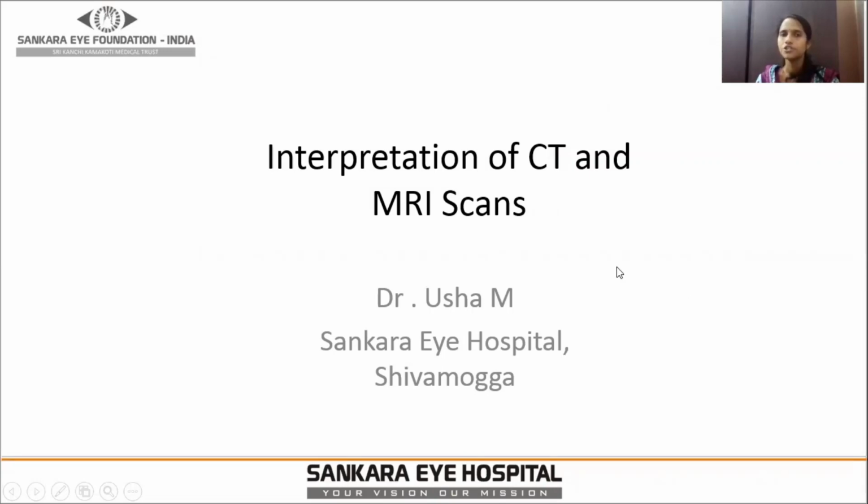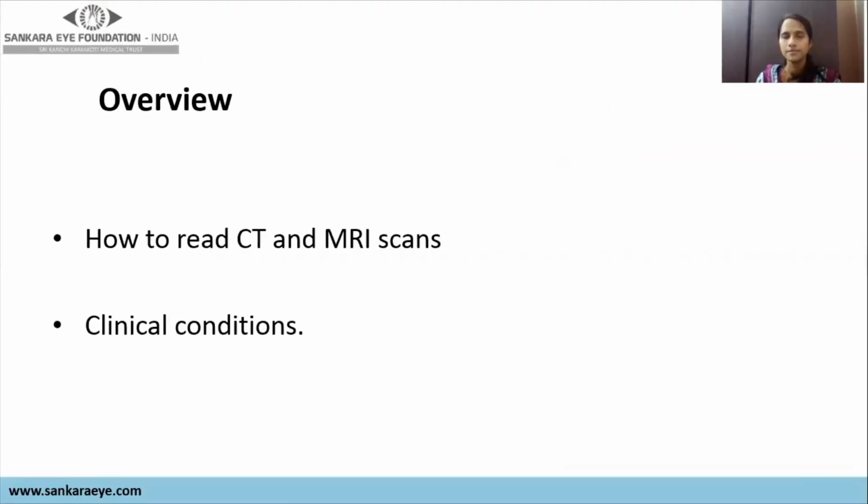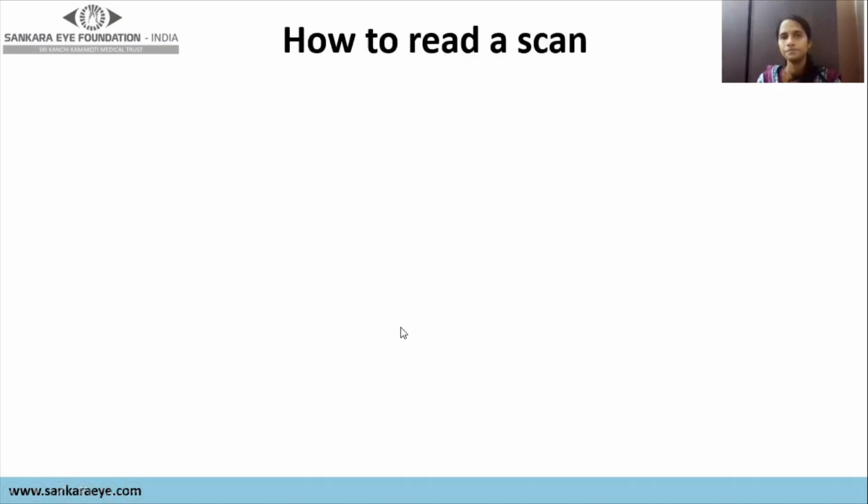In today's presentation, I will be talking on the interpretation of CT and MRI scans. In the initial few minutes, I will be discussing how to read a CT and MRI scan, followed by some of the films based on clinical scenarios. So, how to read a scan?